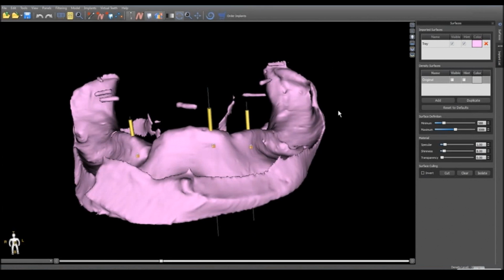So you get a scan of your patient, and you put the implant in the crest of bone, and supposedly that should be fine, except for the fact that in a number of cases, in the lower anterior especially, the soft tissue ridge is located buccal to the hard tissue ridge. So if you do that, then an error will occur, and that means that the implant will be square in the bone, but will be lingual to the soft tissue ridge, meaning that the denture flange will have to be thickened or a lump placed in order to house the attachment housing.